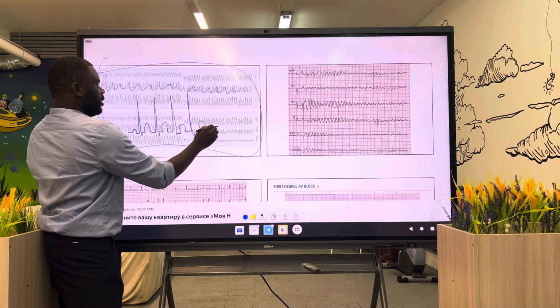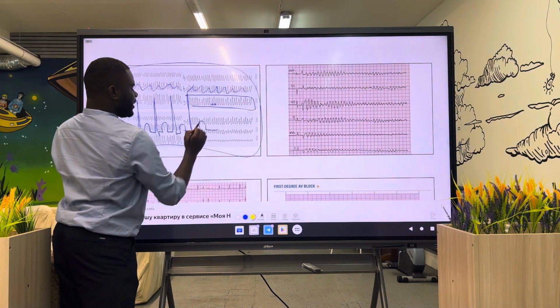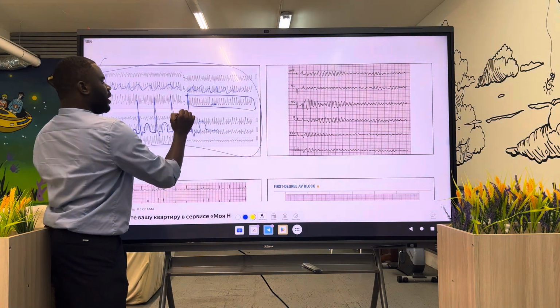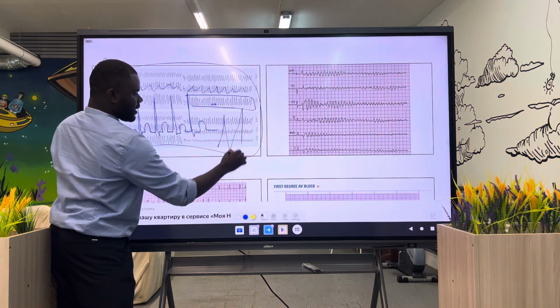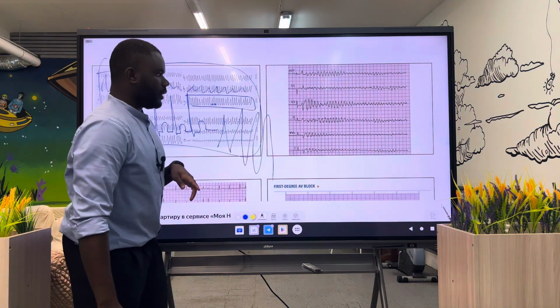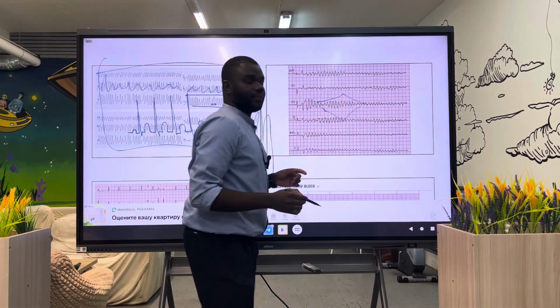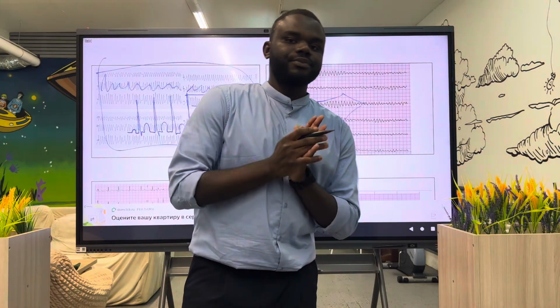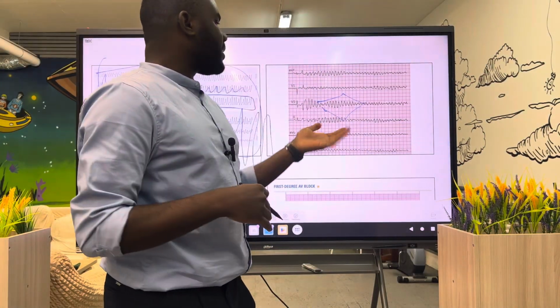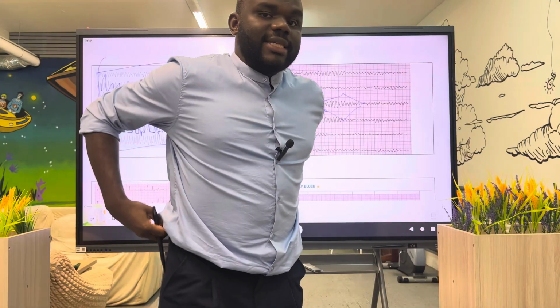But in this case, there is no T wave in between all these things. So SVT looks like this, but this one looks sharp. The next one goes, the next one goes. This one is our friend, the beautiful one, known as the spindle shape formation. Ladies and gentlemen, this is the second part of the ECG lesson.